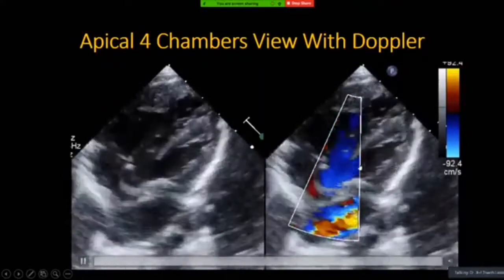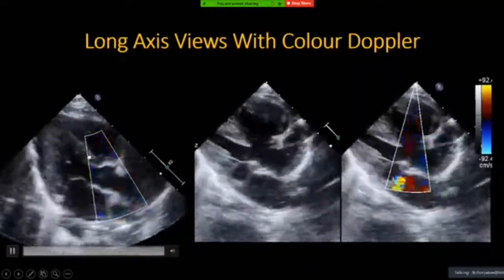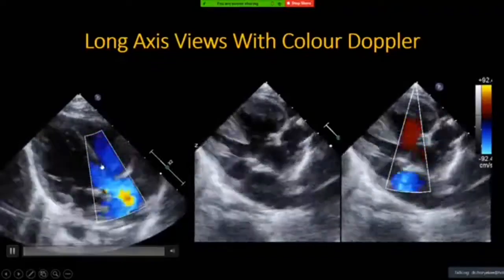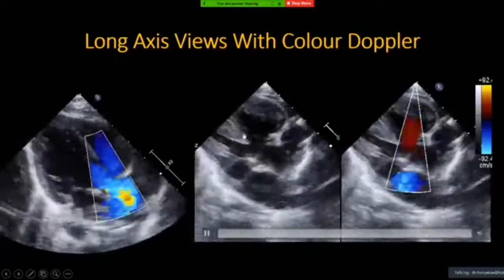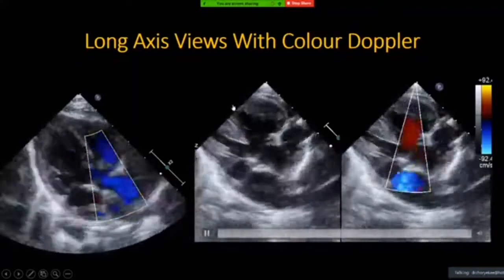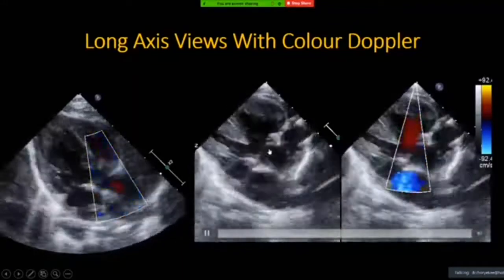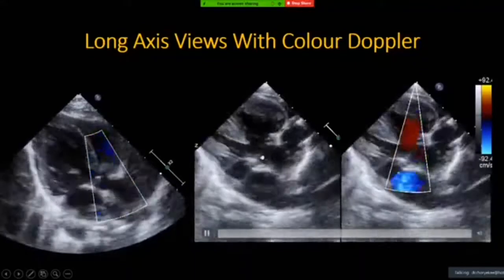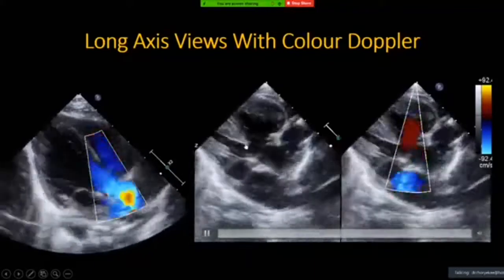When you look at this long axis, compared to our normal long axis, the septum should be connected at the edge of the aorta. This is the VSD, a large VSD, and you see that the muscle wall is very thickened. And this is the aorta. When the septum is seated over the midline of the aorta, we call it overriding of the aorta. So this is overriding of the aorta.